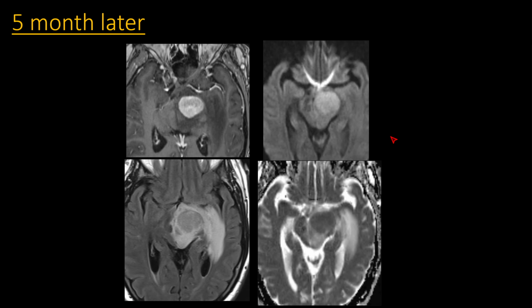So here's that case at a 5-month follow-up. You can see now this patient has developed a clear enhancing mass in the cerebral peduncle with homogeneous diffusion restriction and substantial surrounding vasogenic edema, as you can see here on the FLAIR image. So now the main imaging differential diagnosis here would be lymphoma with these features, and that's exactly what this turned out to be. Now this patient probably always had lymphoma; those more nondescript diffusion restricting lesions on the prior slide were probably all lymphoma involvement as well.